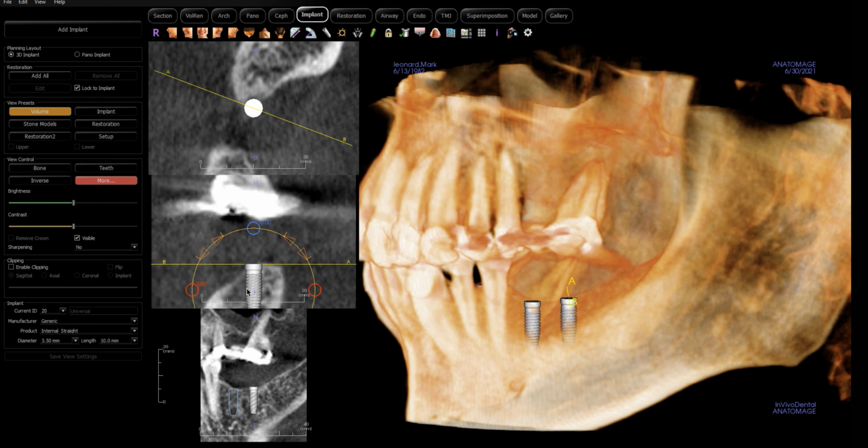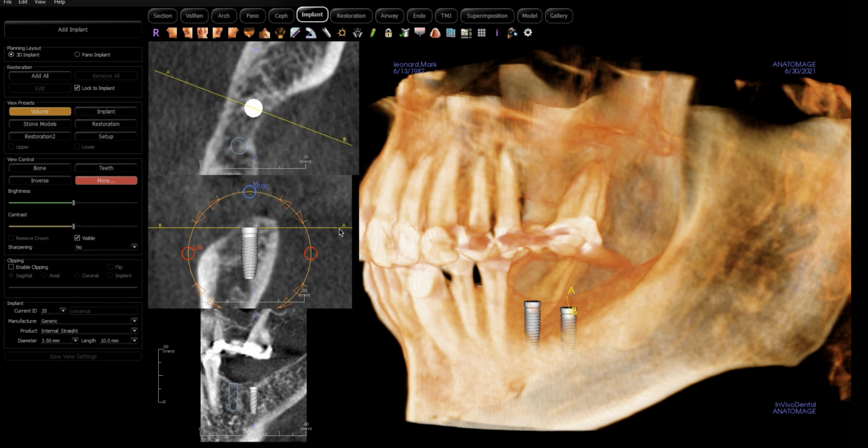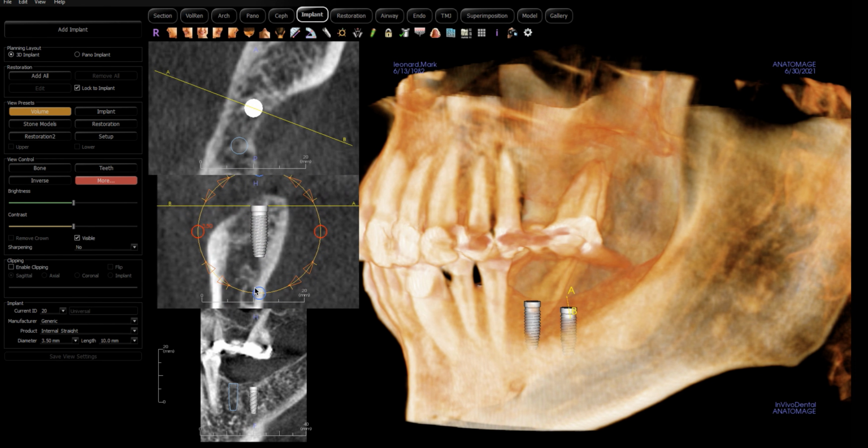Many surgeons would simply just maybe bring the implant here and mow down the ridge. Obviously, this has a lot to do with where the nerve is. That's the nerve right there, so we're very far away. That would be the easiest way to do it. You submerge the placement of the implant, but then you flatten the ridge so that you get that cancellous bone right here.